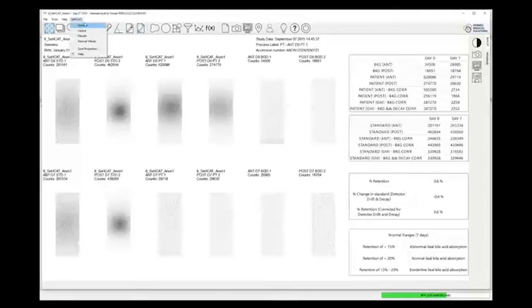String matching wise, it can be done based on the standard string matching tools, or if you wanted to, you can configure it so that it will pick up either detector 1 or detector 2 as your anterior and posterior. You've now got a lovely configurability here for normal ranges, so you can define it for your custom, or you could select the standard. It's entirely up to you.